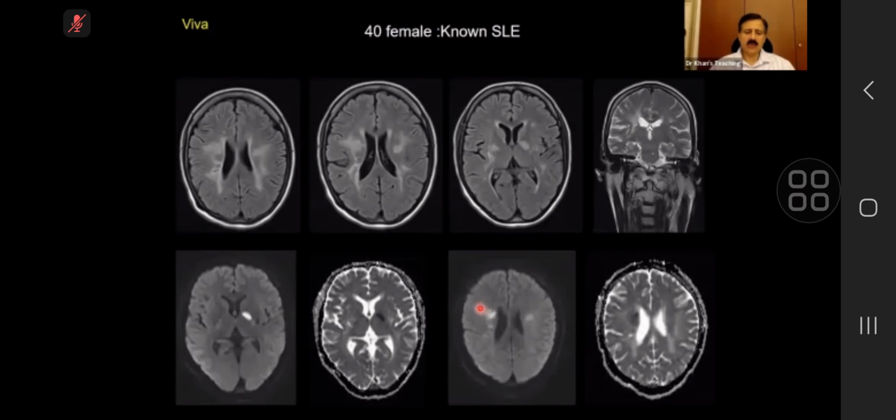By definition, the word lacune was coined by Fleschner, who is a radiologist from USA, I think in the 1960s. A lacunar infarction is an infarction which can be between 5 and 15 millimeter. The concept is that it is supplied by an end artery, by a small vessel, and that is why we call it a small vessel infarct. When there is a large territory infarction, as in MCA, ACA, PCA infarction, we call it a large territory infarct. So you can see lacunar infarctions here.